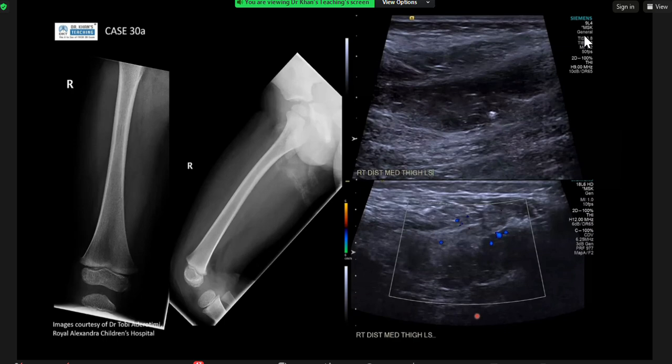the other side. They are called vascular malformations. And I'll explain the difference in a bit. So you're right, these are phleboliths, and the reason why I gave the history, so they are usually just dysplastic vessels. Okay, it can be lymphatic vessels, it can be venous vessels normally, or a mixture of venolymphatics. Unlike hemangiomas, which are tumors, these are more ill-defined, and they also demonstrate very low flow.